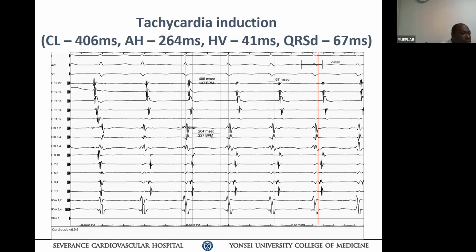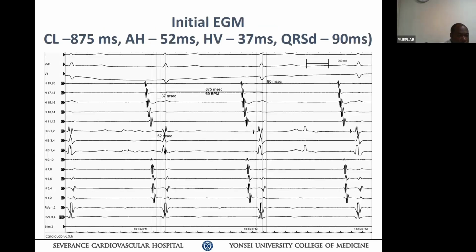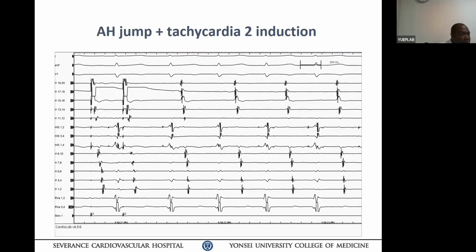Now the question is, which one causes syncope in this patient? Atrial tachycardia or AVNRT? AVNRT more likely. Yes, AVNRT. At baseline, before pacing, it looks eccentric, but the CS catheter was not deep inside. CS 5-6 was maybe at the roof of the CS, very proximal, and 3-4 is slightly in. So that's probably what it is. So after ablating AVNRT, you only induce the atrial tachycardia.